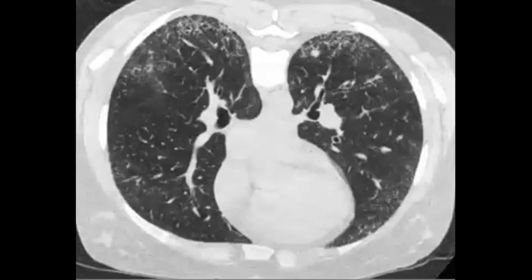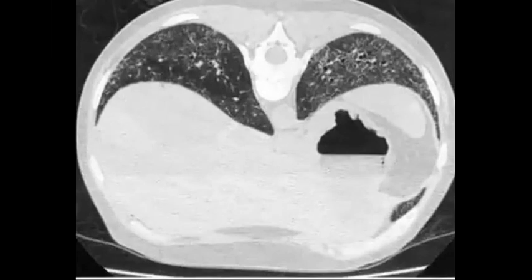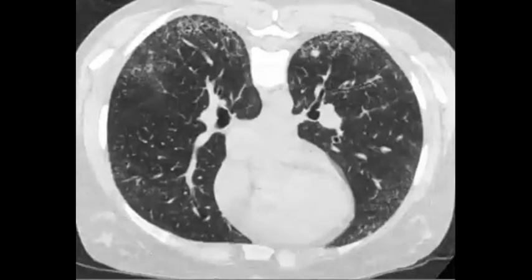If we go to the prone position, they are persistent in the lung bases. So this interstitial infiltrate with ground glass and septal thickening, subpleural, moving to honeycombing, could be UIP, usual interstitial pneumonia. I agree with you. What other differential can you put?